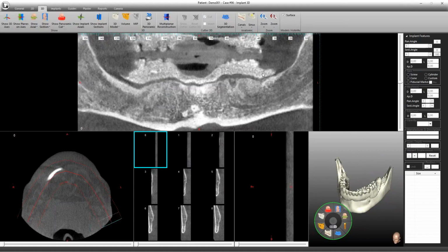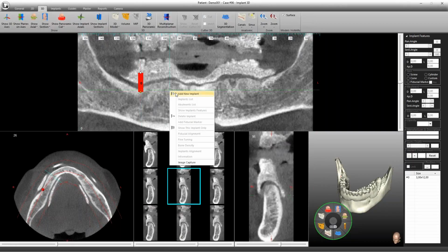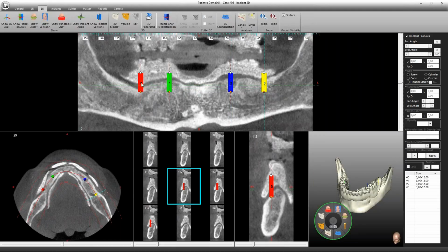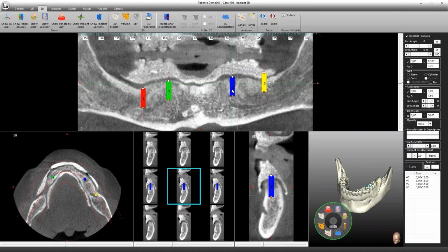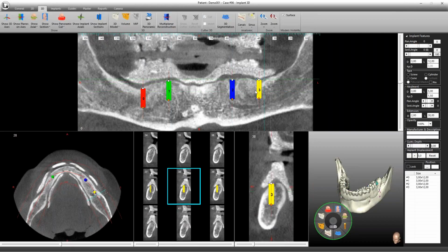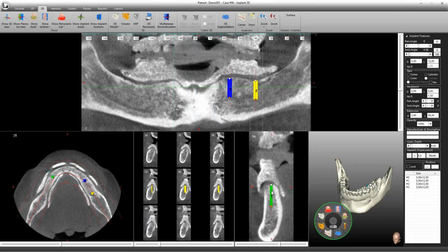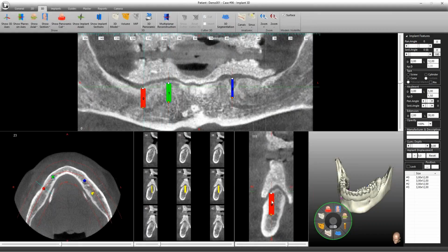Now let's proceed with the implant planning. As you can see, it's really easy to place an implant in a very fast way. A new implant right here, right here, right here, and right here. And after performing this insertion, I can lower the implant position in this manner in order to place the implant wherever I want. Okay, so if I put the implant like that, of course I can regulate myself with the cross section in this manner and also in this manner.